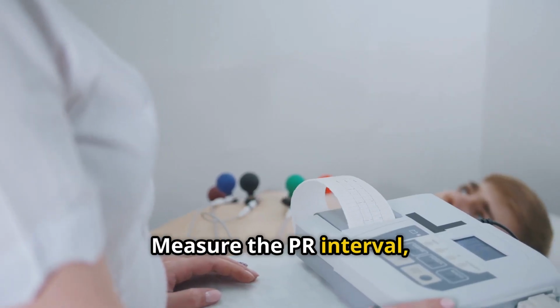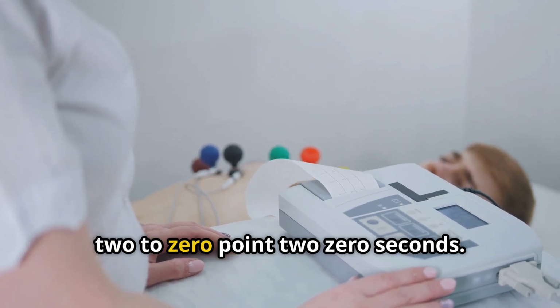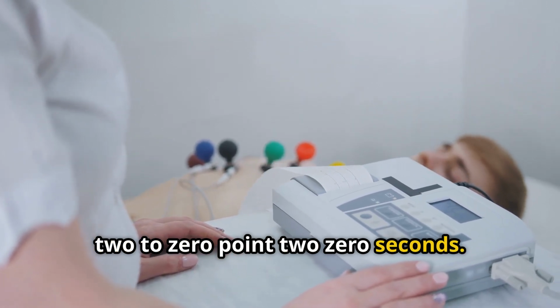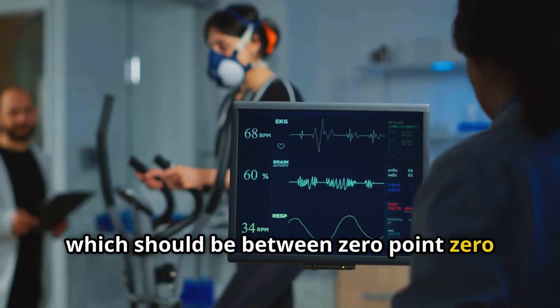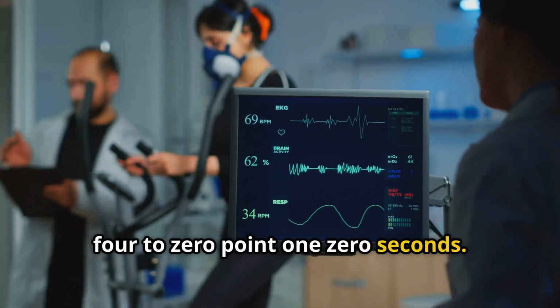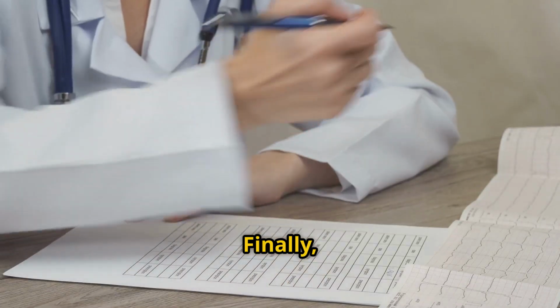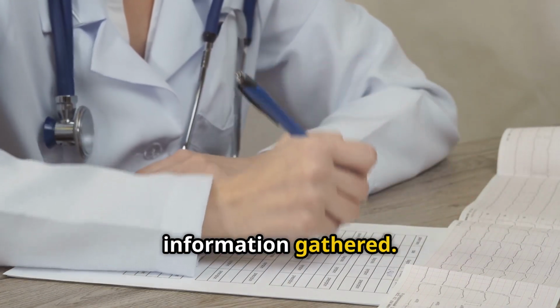Measure the PR interval, which should be between 0.12 to 0.20 seconds. Measure the QRS duration, which should be between 0.04 to 0.10 seconds. Finally, interpret the rhythm using the information gathered.